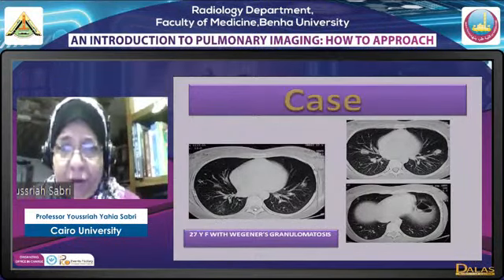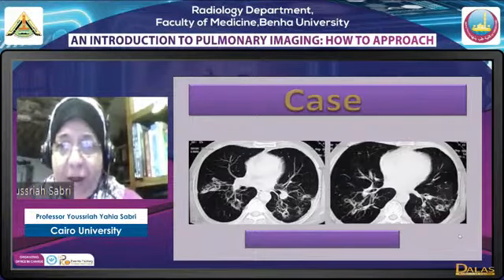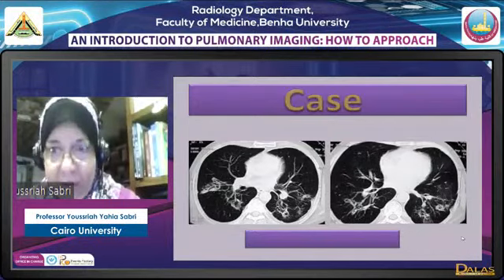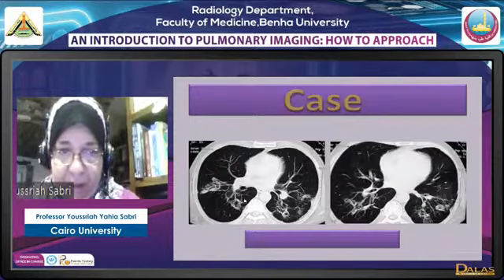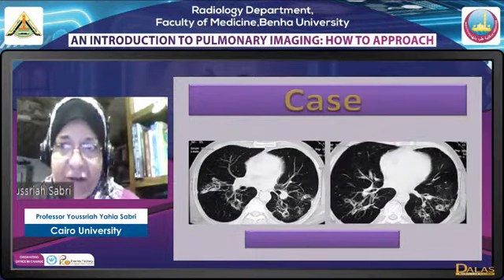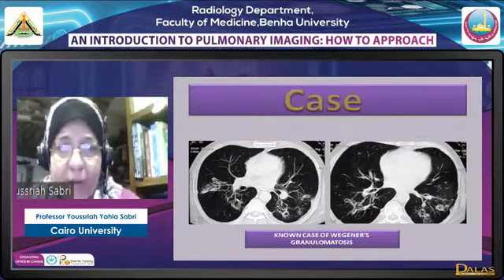Nodules, cavitation, irregular nodules, bilateral, countable. A very strange appearance here, and a rule in medicine in general, not only in radiology: don't panic. Just look properly and try to assess the problem you're dealing with. We have nodules here, and those nodules are cavitating. Some of them are bizarre and complex in appearance. They are bilateral and they are countable. We may be dealing with atypical infection versus a case of vasculitis. Again, this was a case of Wegener granulomatosis.